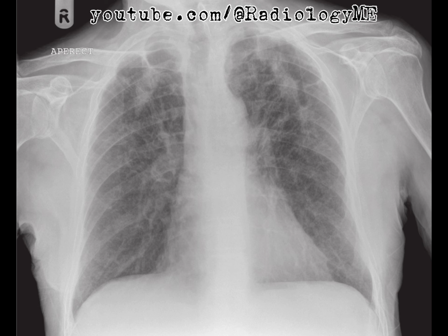The complication of silicosis we're seeing here, progressive massive fibrosis, is often bilateral, symmetrical, and takes the shape of these sausage-like masses that change very slowly over time. It's important to remember that silicosis is a predisposing factor for tuberculosis, so any pulmonary masses might not necessarily be benign, they could be infectious. And we also need to be on guard for coexisting malignancies, since silicosis increases the risk of lung cancer.